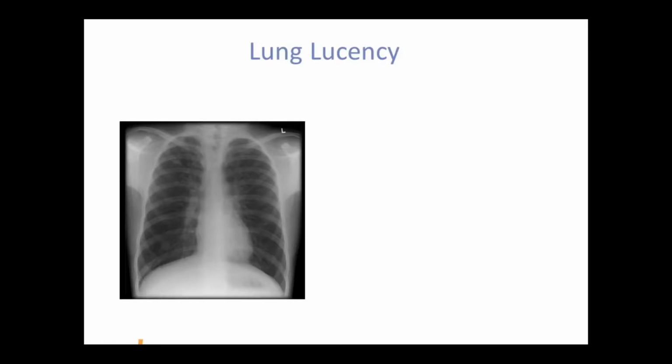However, you move along and find that the inspiration and rotation are normal for this film, but find that the lung fields look taller than normal. You do not see a thymus nor any masses, and the heart seems to be a regular size and shape. You revisit your previous findings of a hyperlucent lung with enlarged lung fields. What do you think is this patient's medical condition?